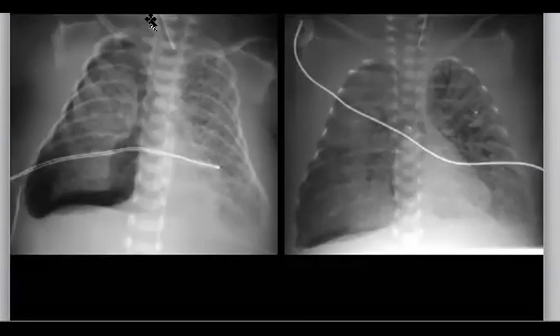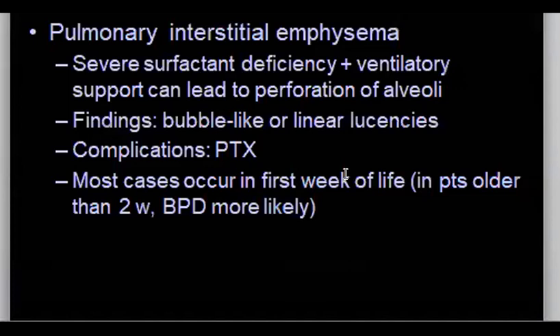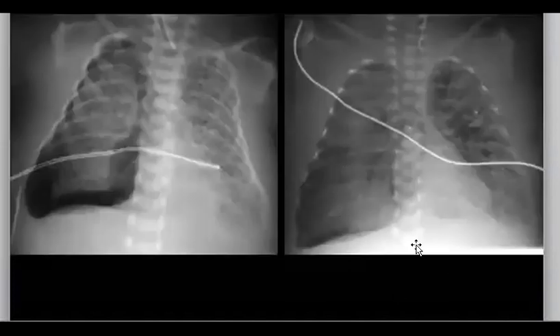The endotracheal tube here, if we consider the carina, exceeds 2 centimeters, right? Yeah, it's in a very high position. And also the umbilical catheter, you can see something here, it is above the diaphragm. So it's not in a proper position.